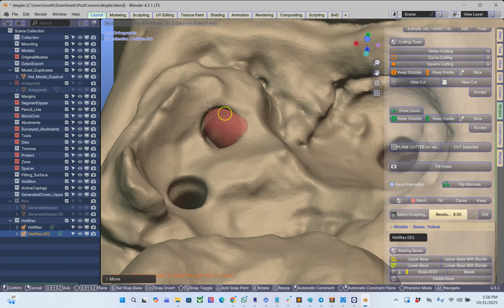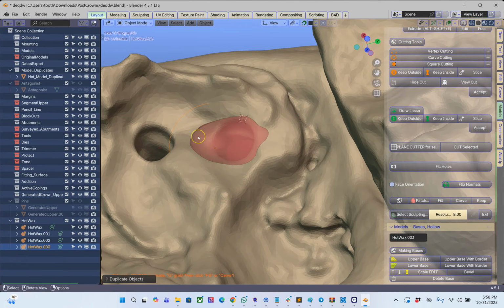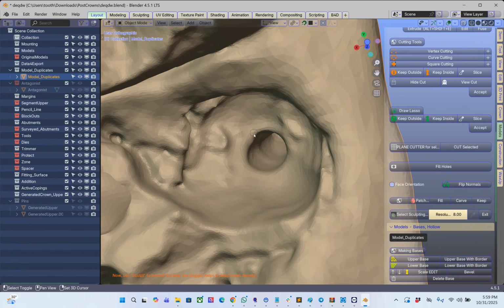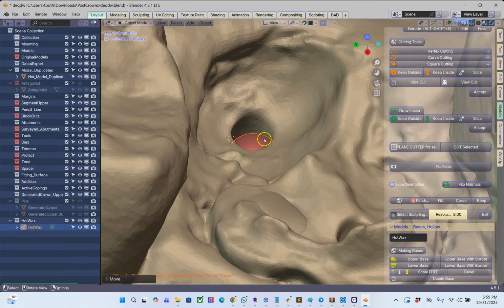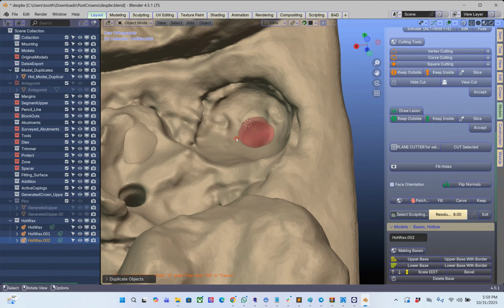Shift D, Shift D, Shift D. Great. Okay, and then what we're going to do, just click on fill. I'm going to do the same here, and we do this exact same procedure in the dental lab. So I'm drawing my strength now from the laboratory techniques. So Shift D. Okay, and those of you that have made these posts are quite familiar with this.